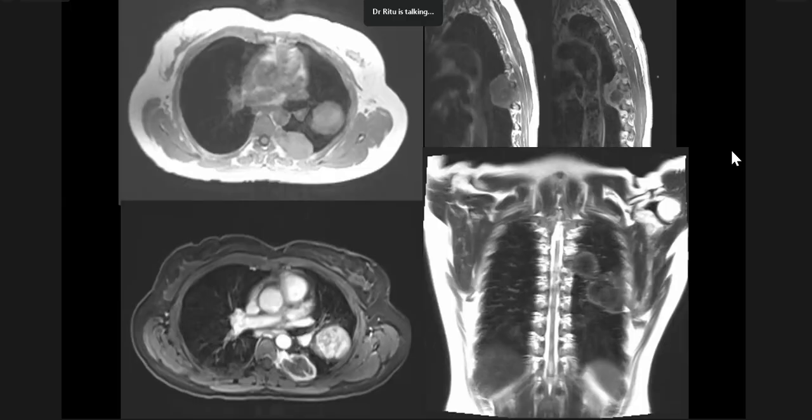So she got an MRI done, and you can see on the MR that this is T1 dark and T2 dark. So that tells you this is fibrous tissue. And then on post contrast, it enhances very homogeneously. The posterior mass doesn't have enhancement, it has a septation. But by just looking at the imaging characteristics on MRI, you can pinpoint that this is indeed fibrous tissue.